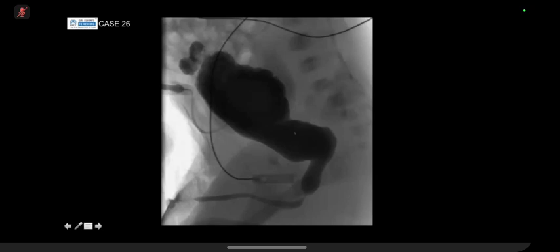Yeah, this is very good. Well done. This is a case of posterior urethral valves. If it was going to be a dilated ureter, you tend to see them coming posterior to the bladder on the lateral view, rather than starting at the dome of the bladder, just to help you differentiate between reflux and diverticulum. And these look very rounded to be refluxing ureters. So you're completely correct. This is a case of posterior urethral valves with evidence of bladder outlet obstruction, because you can see trabeculation of the bladder and diverticula.